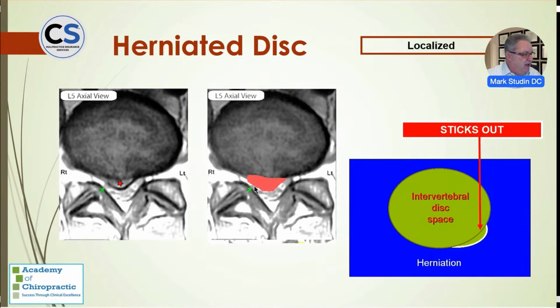This is the lumbar spine, and it's compressing the cauda equina because it's pushing the cauda back into the ligamentum flavum. So it's pushing on top and the bottom. This would be defined as a large central herniation, which is stenosing the central canal by about 40 to 50%, and it's compressing the thecal sac between the herniated disc and the ligamentum flava. And you see this green line here on the right, L5, it's catching the L5-S1 nerve root as it's exiting.